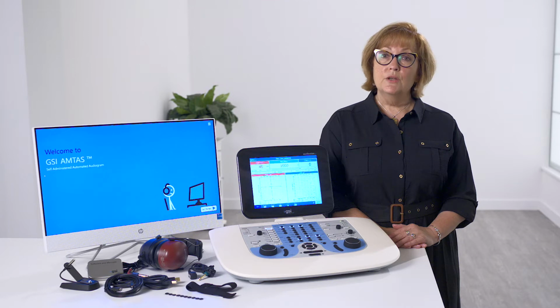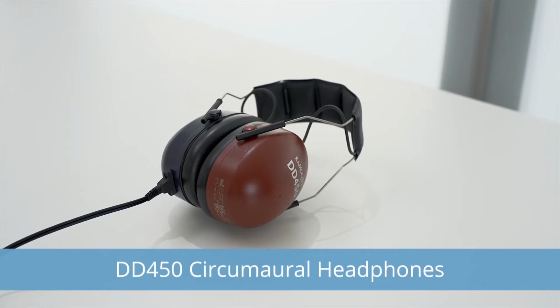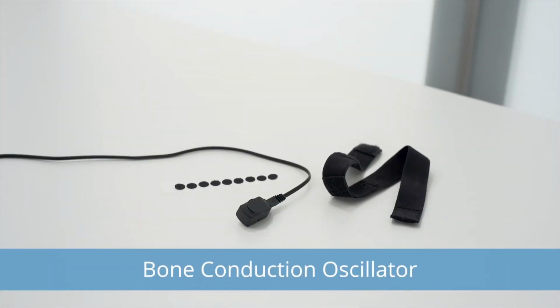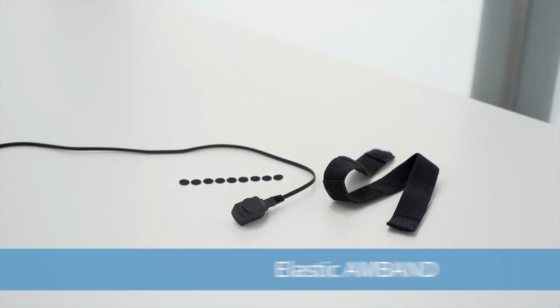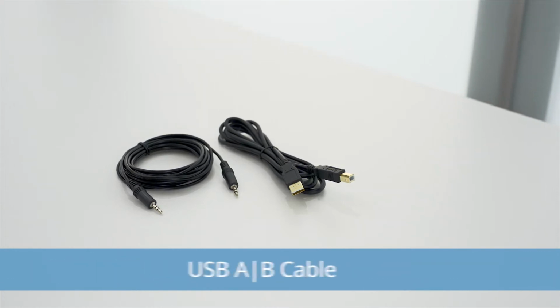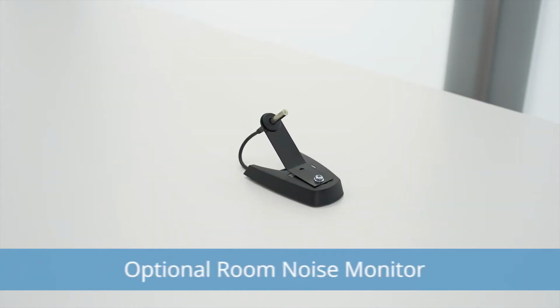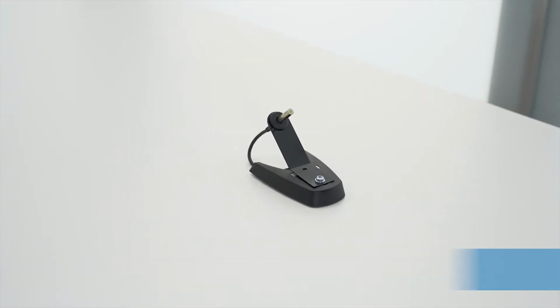To test a patient with AMTAS Pro, you will need the following: DD450 circumaural headphones, the bone conduction oscillator removed from the silver headband, an elastic AMBAND, Velcro dot, aux stereo cable, and the USB A to B cable. The room noise monitor is available as an optional accessory. It provides an analysis of the noise in the test environment and will alert the user if a threshold may have been affected by excessive noise.